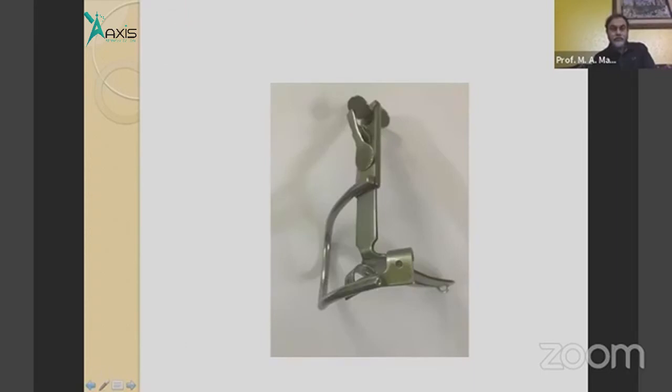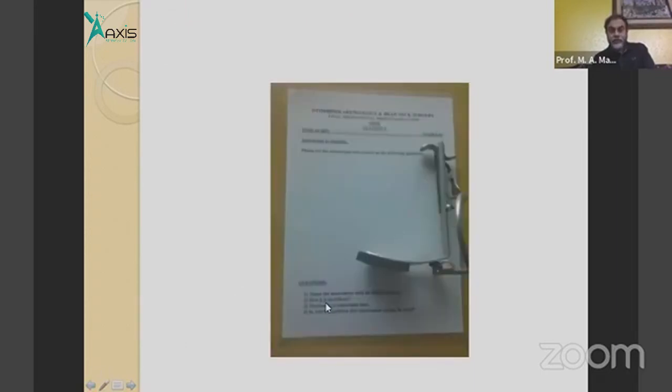Okay, so the question was actually to name the instrument parts. Now, how is it sterilized? Any surgical instrument, any metallic instrument, we have only two procedures for sterilization. One is autoclaving, and the other is boiling. So there are only two procedures, autoclave and boiling.